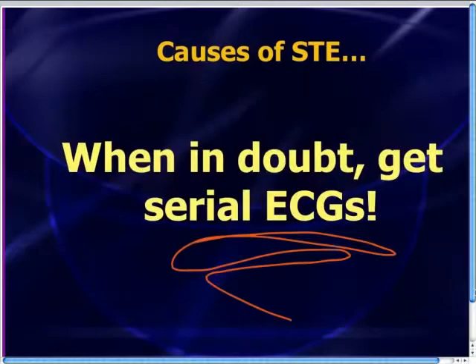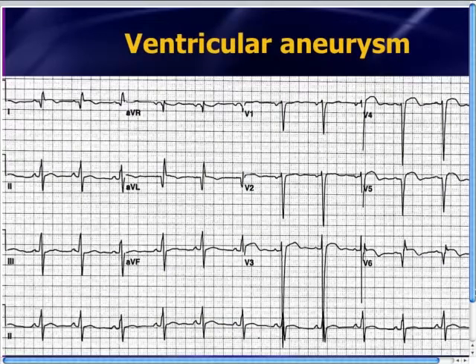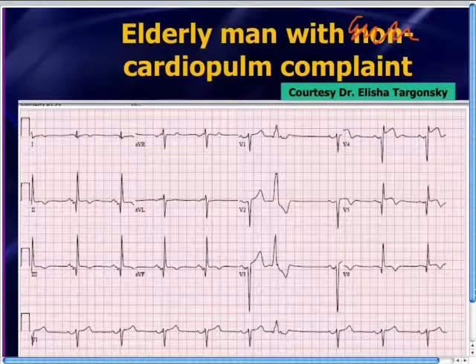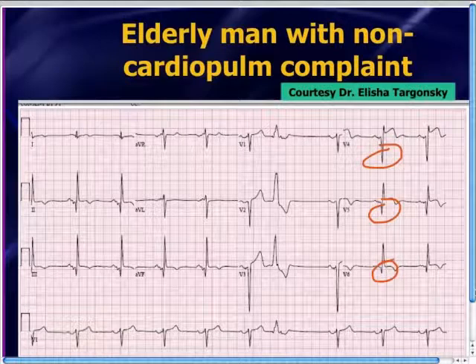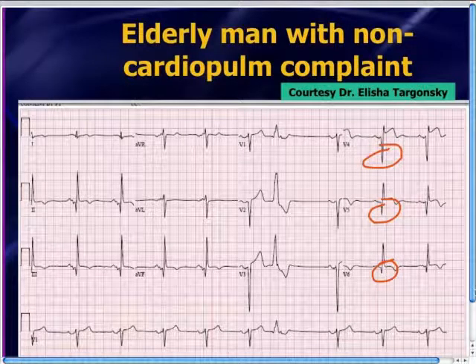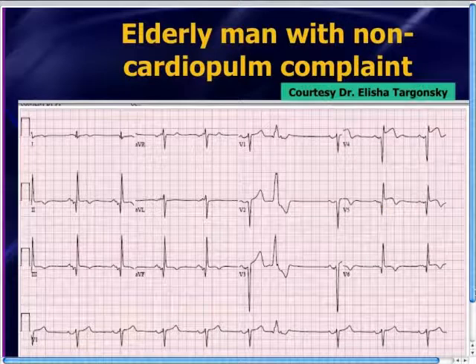And when we look back at, actually, let me go back to the EKG here. When we look back at this original EKG, there's some things that are helpful. Notice you definitely have Q waves. And so that can be either one. So that's not all that helpful. If we didn't see Q waves, we definitely call this a STEMI. All right, what else? Notice that there's no reciprocal changes.